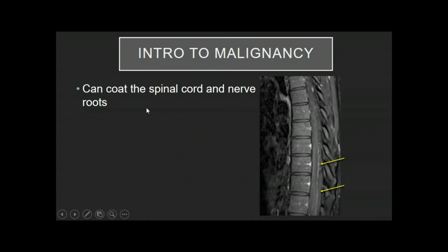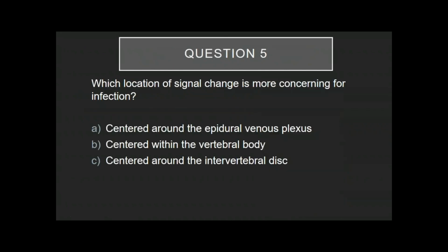And it can also coat the spinal cord and nerve roots, similar to what we saw on the infection study, right? So here's all this enhancement going along the spinal canal, along the cord.